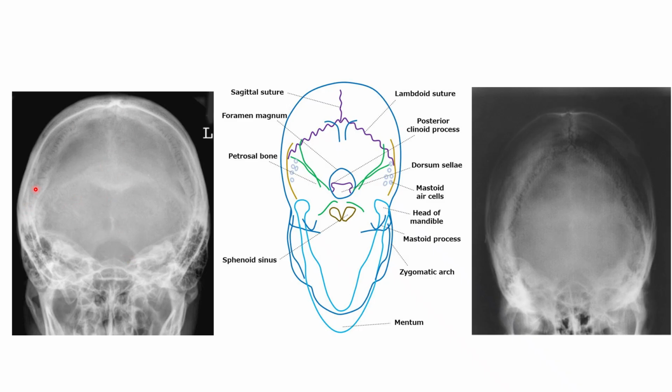I'm looking at these suture lines here. The way those suture lines look is very similar to the way these look. They look like little squiggle lines. I'm not speaking in anatomical or radiographic terms there, but you can follow those little suture lines up and know that the occipital bone is centered on the image here. So we are demonstrating the full occipital bone on both images.